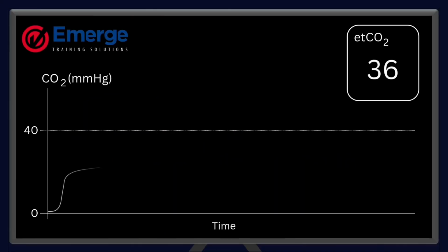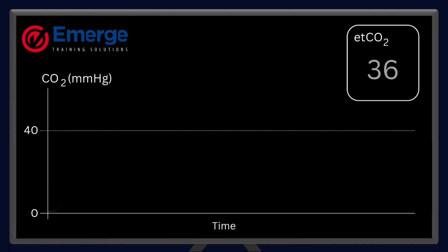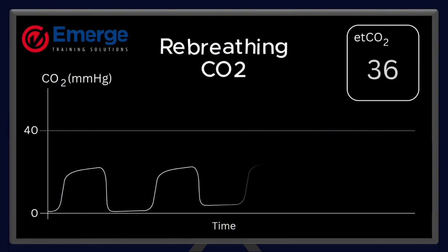Take a moment to look at this waveform. What jumps out first is that the baseline, the flat portion between breaths, never truly returns to zero. Instead, it hovers above the line and gradually creeps upward over time. That is the classic fingerprint of CO2 rebreathing.